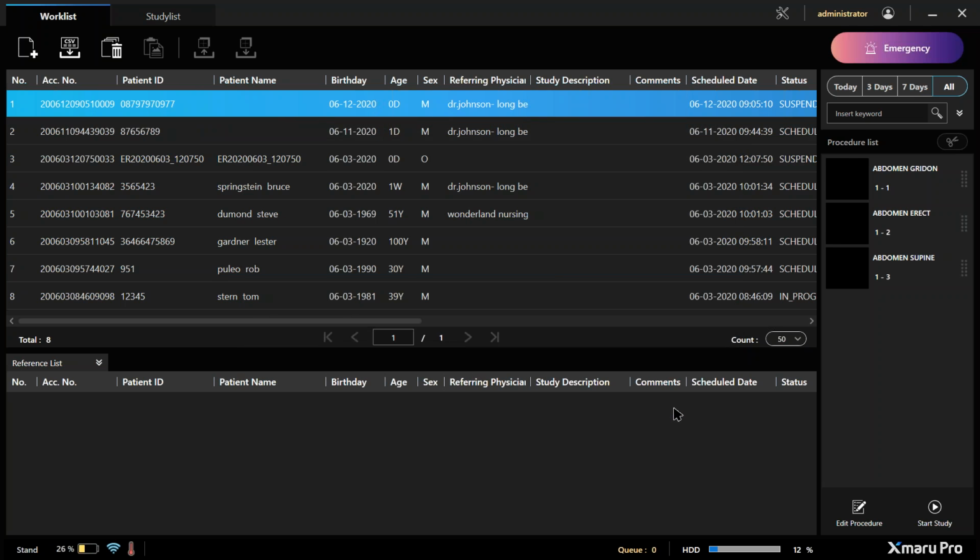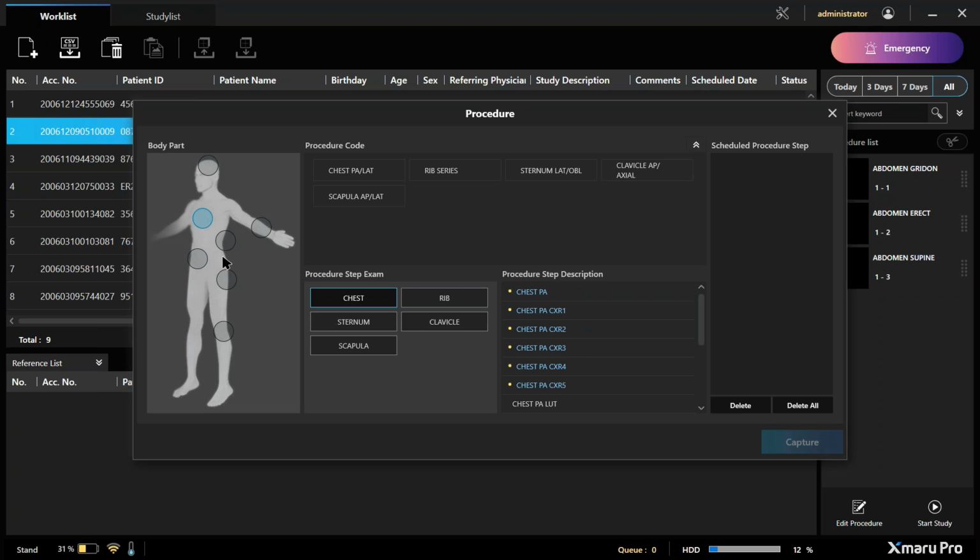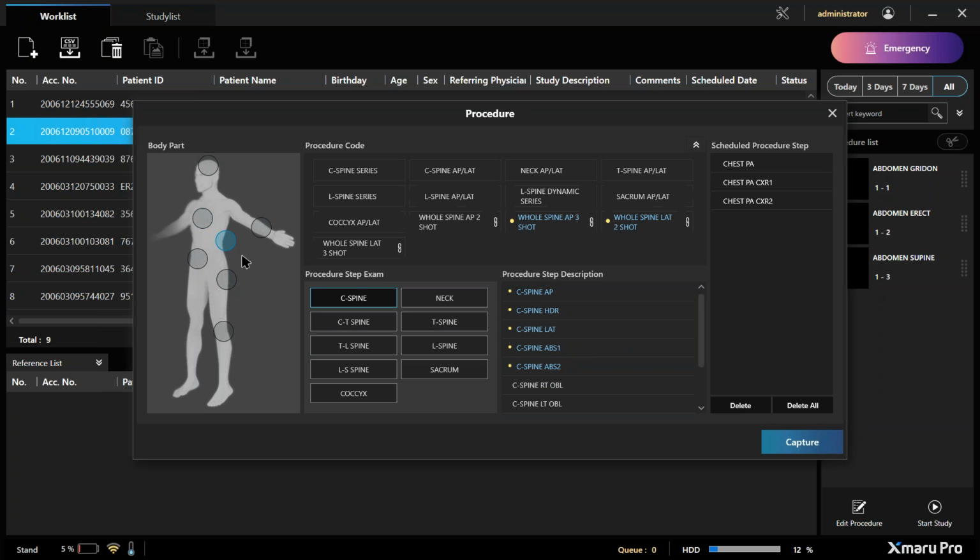When you click on capture, it goes now to the new procedure page. You'll notice it looks very similar with some changes. Right? The body parts are still here, but the multiple views are along the top. The general body area is highlighted, and the individual views are now simpler and quicker to locate. This reduces a lot of the common scrolling that was found before and wasted a lot of unnecessary time.